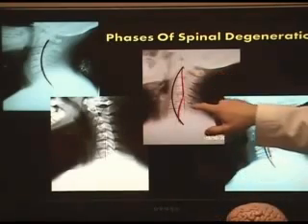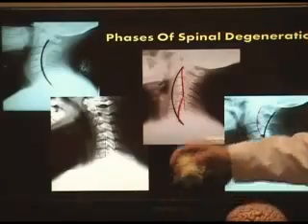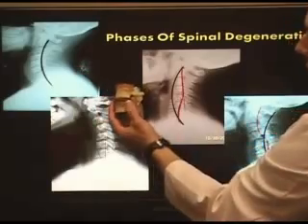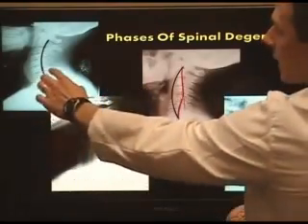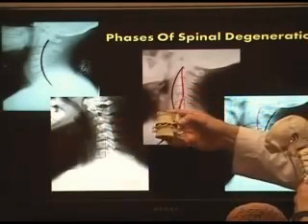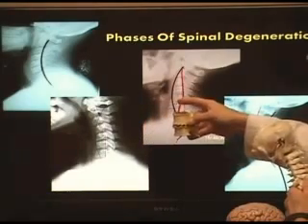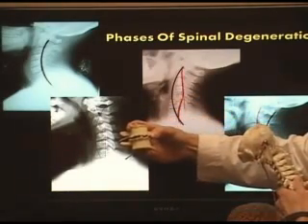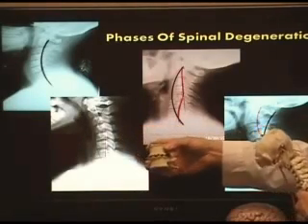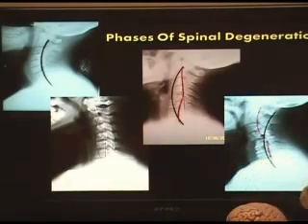When you have more loading on the front, over many years, if you don't have that corrected, you go into phase two. In phase two, the disc spaces start to get really, really thin. Instead of nice, big, healthy disc spaces like you have in the normal one, nice open spaces, which are these little black areas in here, the longer you're in phase one, eventually you go into phase two, and you start developing discs that are severely decayed and degenerated. Instead of nice space between the bones, you have these discs that are falling apart. That narrows the space where the nerve exits out, and it creates a host of problems: it can cause chronic pain, it can cause pressure on that nerve, you can have all kinds of issues.